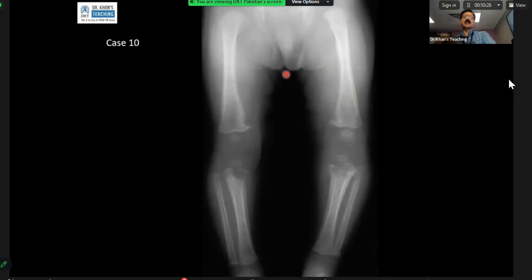I don't see any femoral capital epiphysis, and then you describe these findings. Also, whatever the differential which is relevant in this age group, mention that. Other than these erosions, the rest of the bones appear normal in density. Then there is no evidence of Wimberger sign as far as the epiphyses are concerned. There is no Pelkan spur. There is no metaphyseal cupping.